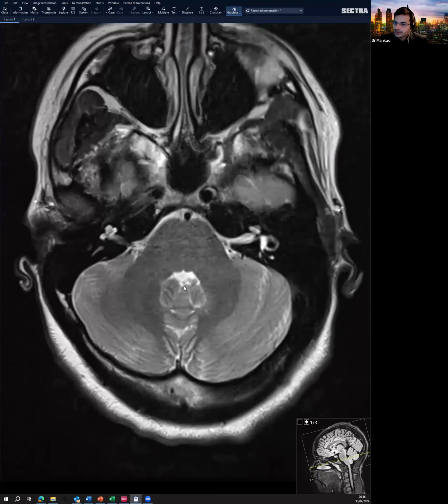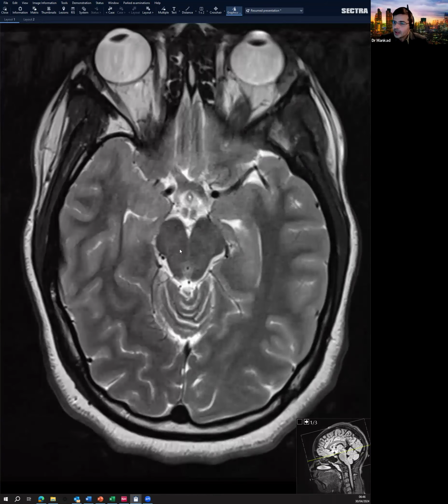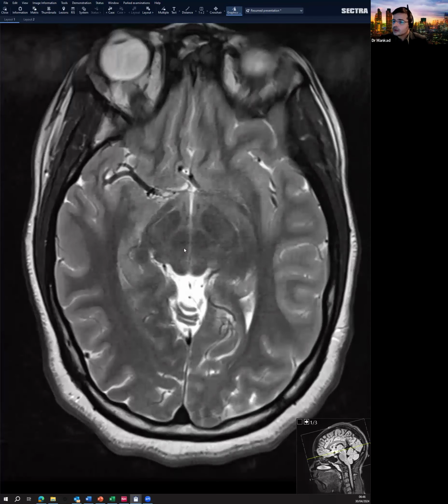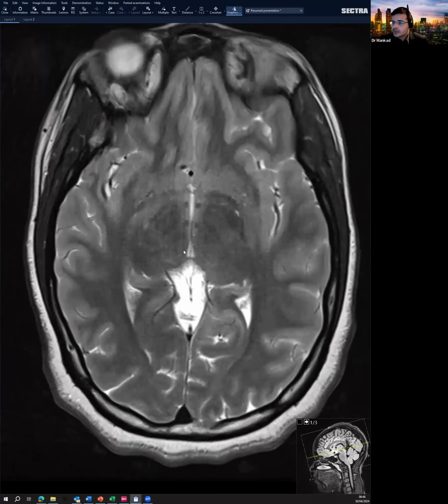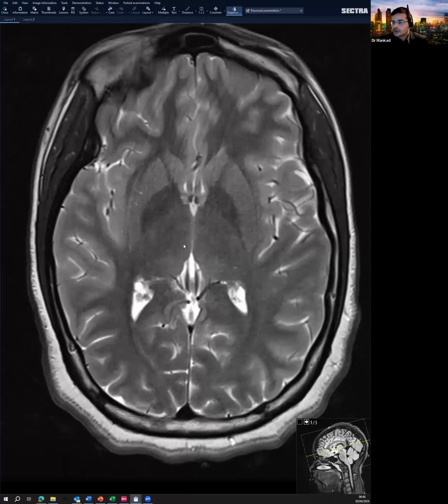So lots of tracts. We have only looked at some amount of the corticospinal tract. If I do come back, I will try to show you a few more tract-based imaging, which we can do now. Not always visible on conventional sequences, easily demarcatable, but it can be looked at with tractography, and we will look at a lot more of those white matter tracts. The networks of the brain will be better understood when you know what the tracts look like. Now, I'm going to keep the anatomy quite simple. The first thing is to get the sequences out of the way.